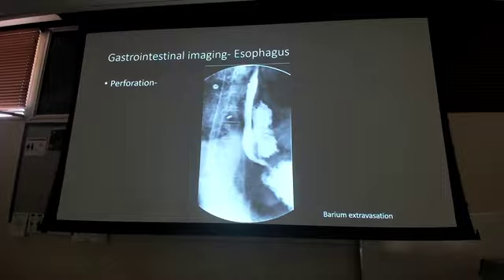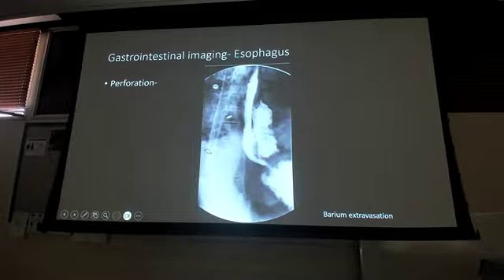I don't have this nice containment here. I've got some that's here, some that's here, kind of comes in here. It's a fuzzy edge, right? It's not this nice, smooth edge that kind of comes around. That's the difference between your perforation and your diverticula: the smooth edge versus the not smooth edge.